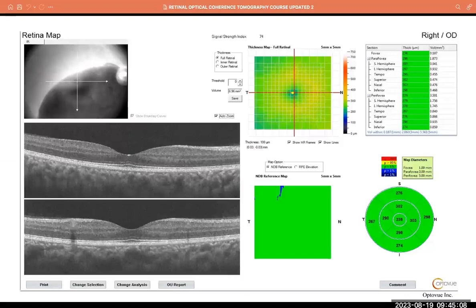And if you use the first image, the topmost on the left, the retinal map, you can see where the disc is. The disc points to the hand. So if you have this, you can say this is the right eye, judging with the disc. If you don't have this first image to the left, you can still make the judgment with the retinal map. So this is the right eye, okay? Okay, so let's go 2 slides down, forward actually.